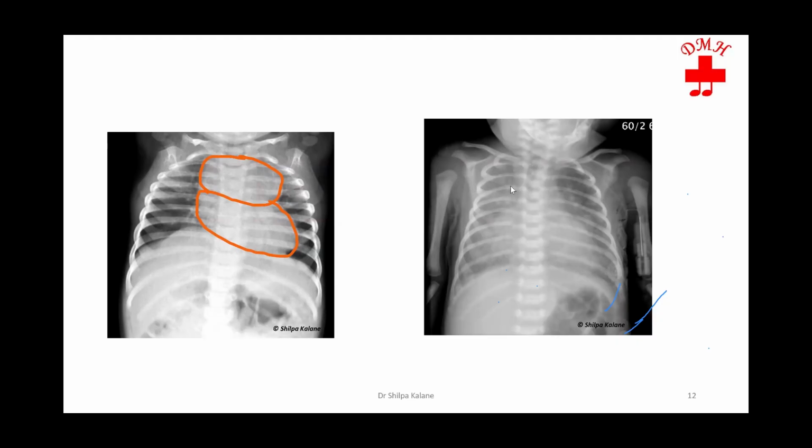Correct? Yes. What about the second X-ray? This also failed the pulse ox screening test. The second X-ray. You can see that these are all flooded lungs. The pulmonary parenchyma is not looking very good. It failed the pulse ox screening test. Difficult to diagnose, and the picture looks like an RDS-like picture, which is seen in infracardiac TAPVC, obstructed TAPVC, right? So it is obstructed TAPVC.